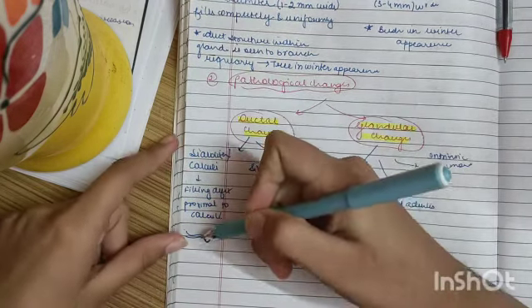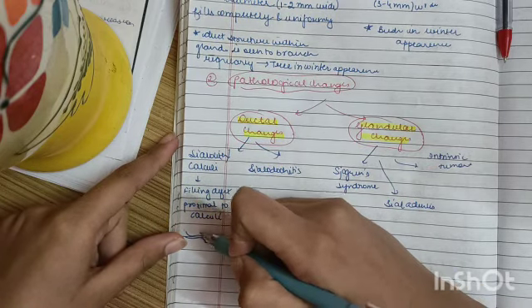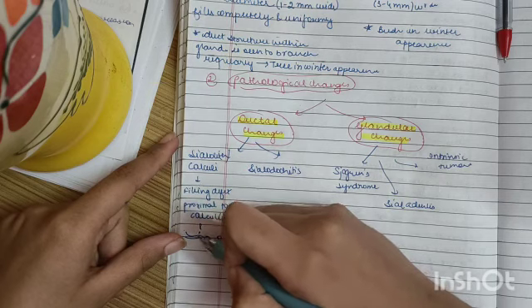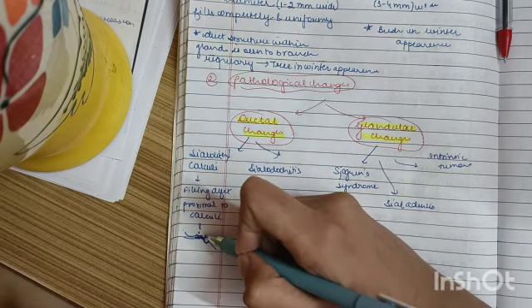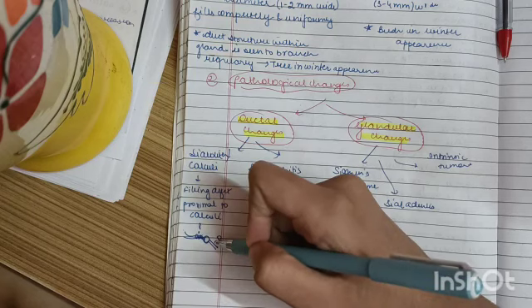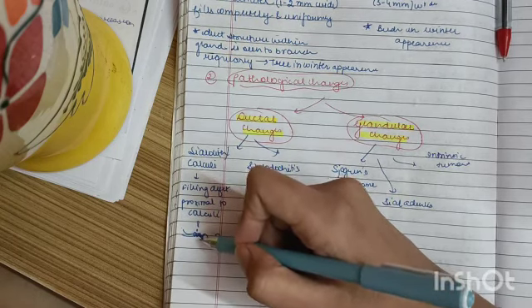So suppose you fill the contrast medium here and this is the calculus. Basically, this is the proximal part and this is the distal part. Here the contrast medium will be filled and will show as an obstruction. It will not pass through the calculus obviously, so it shows a filling defect which is proximal to the calculus. Here the keyword is proximal.